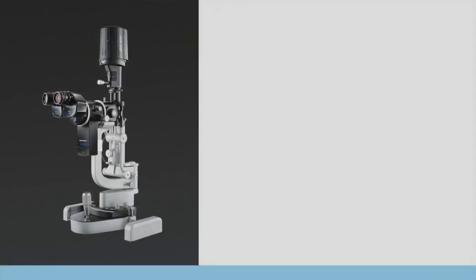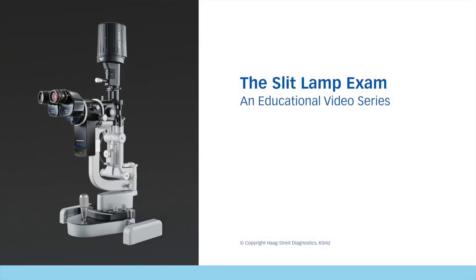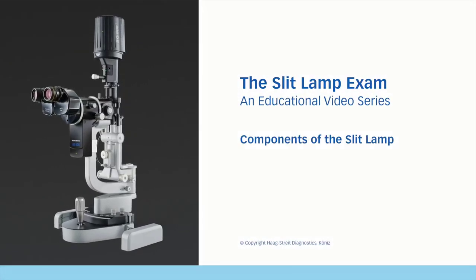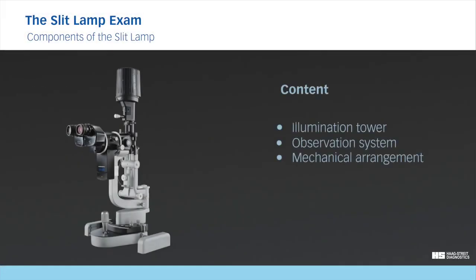Welcome to the video series, The Slit Lamp Exam. The name of this video is Components of the Slit Lamp. This video will explain the workings of the illumination tower, the observation system, and the mechanical arrangement of the slit lamp.